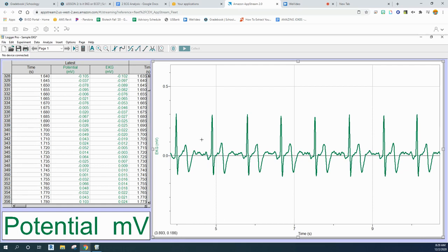And right now, when I look at this, I can see I have some miscellaneous data in here, but it looks like I can find one of these waves. This one looks fairly close here. I can find the P, Q, R, S, and then this T right here. And then there is some residual drop below the line as it's kind of recentering. But this one looks like the clearest P to me. That one looks pretty good. This one, it's a little harder to tell where that one is. That one looks like a pretty good one there.